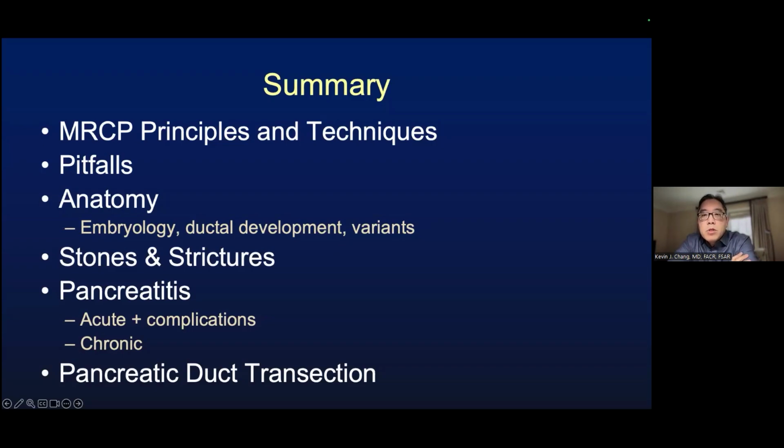Certainly, follow-up imaging could also help. Pancreatitis tends to be a waxing and waning phenomenon, so it should change in appearance over time. But if you have a persistent finding, especially in the absence of pain or elevated serum lipase or other features that you typically associate with pancreatitis, that would certainly raise the suspicion for pancreatic adenocarcinoma, in addition to the usual serum markers that you can run.